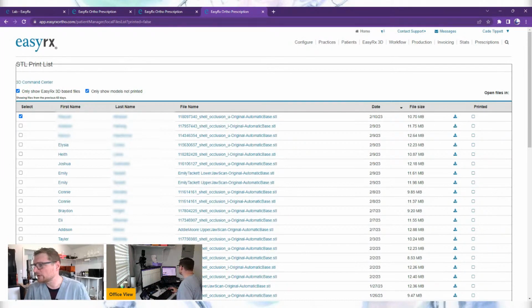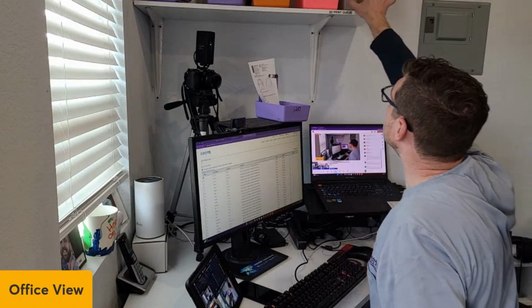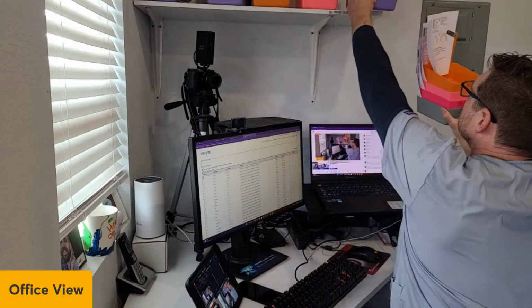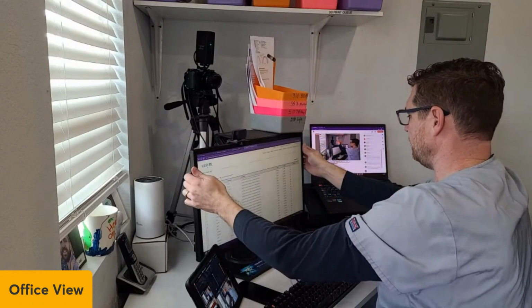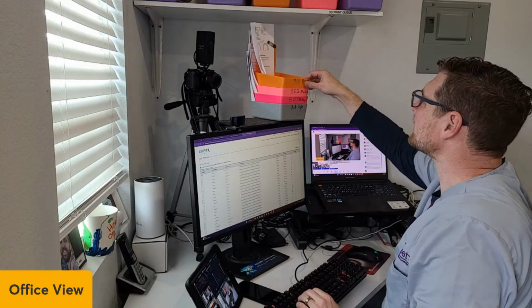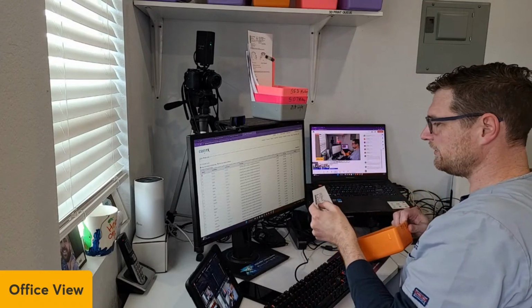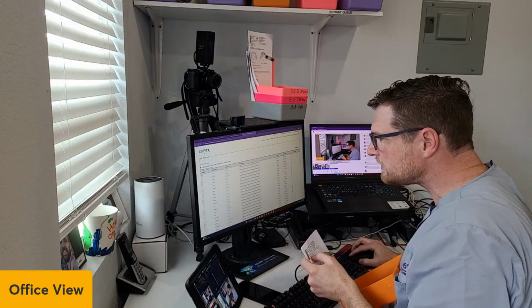Get my mouse over on the right screen. So up here I do have what I think will be 6 that I can choose from. So I'm going to try to find these. Oh, my screen just fell. That's too heavy. So, all right. The first thing I do is I take them, I look at what they are, I look at the name here. So I'm going to look, and here is this one and this one.